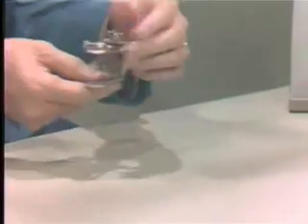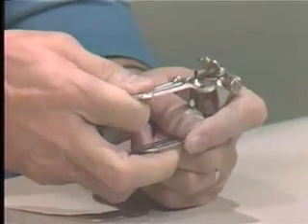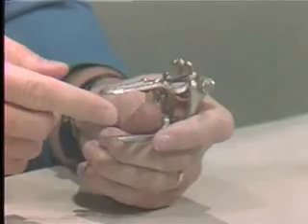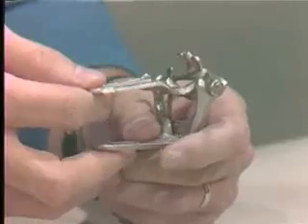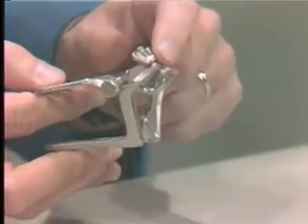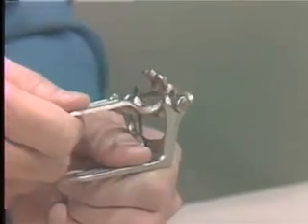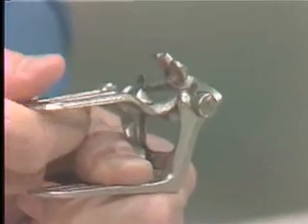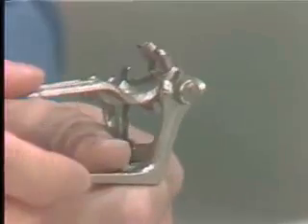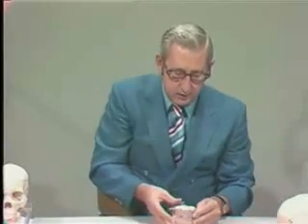Now the next one is a slight improvement over this, but basically the same thing, but it does have some slight compensation for a lateral movement, as you can see. But this is determined either by the guidance of the teeth or by the fixed pattern that the articulator has built into it. You can also control the closure slightly by the screw in the back, so you can regulate that. We have just a very slight protrusive movement that can be done, and you do this, of course, by moving the upper member of this articulator in a posterior direction. Now I have a case mounted that we'd like to show where we use a full arch on this same type of articulator.